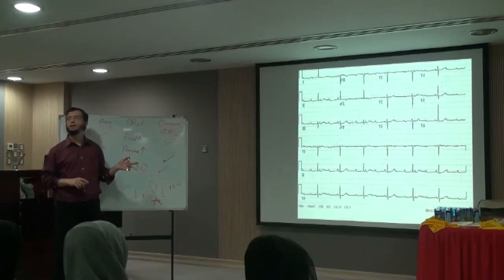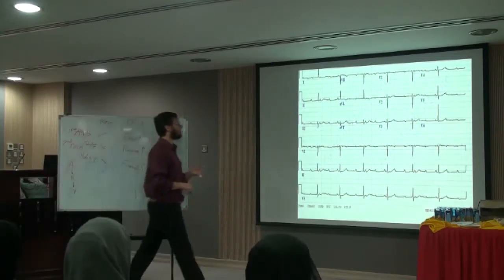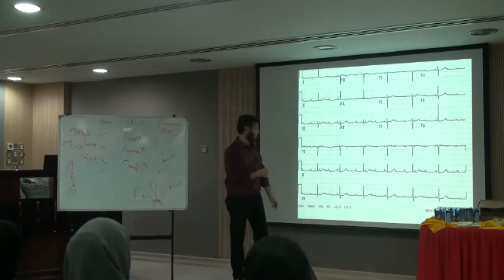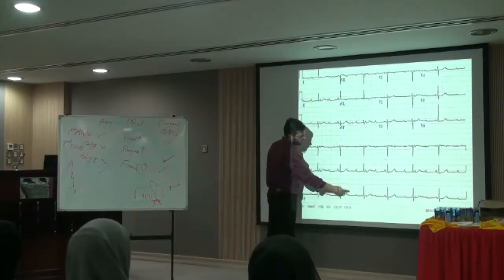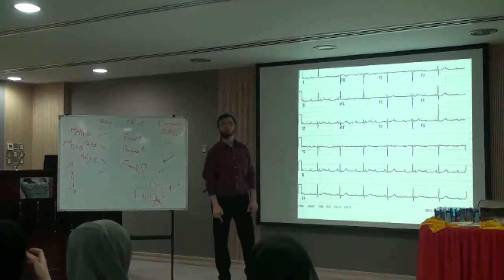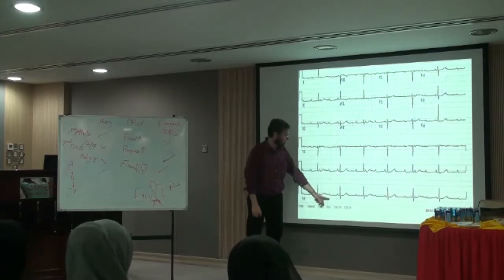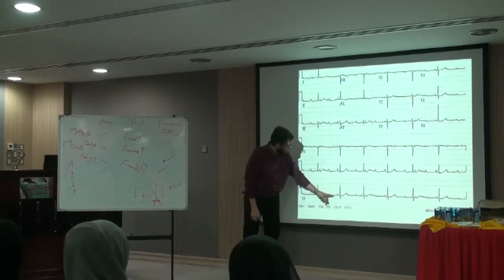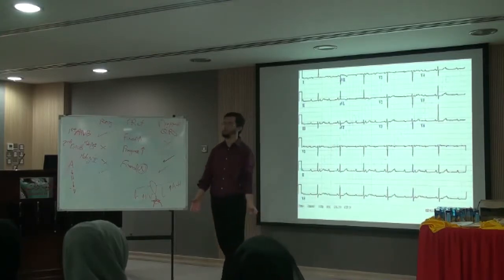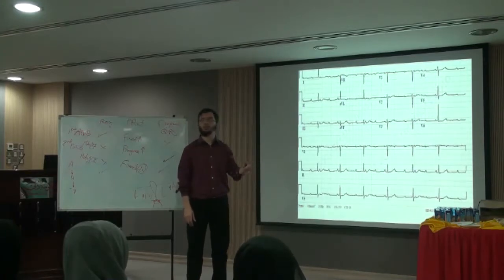How much is the atrial rate and how much is the ventricular rate? Excellent. So we need to see the PP interval and the RR interval. RR interval is how much? 7 something. So it's maybe 40. PP interval, 1, 2, almost 2 or 3. So you can say 100. So the atrial rate is more than the ventricular rate.